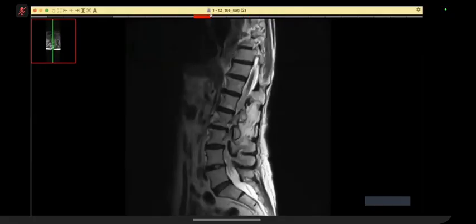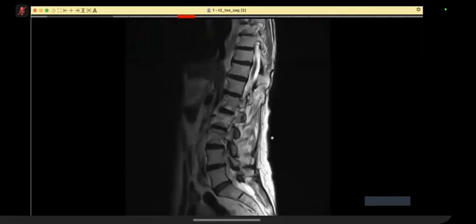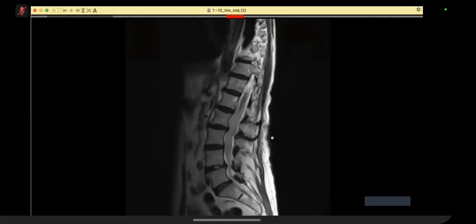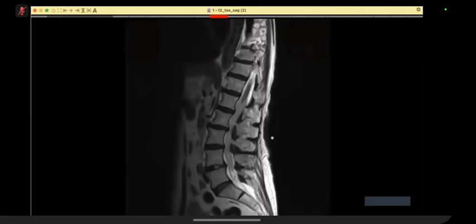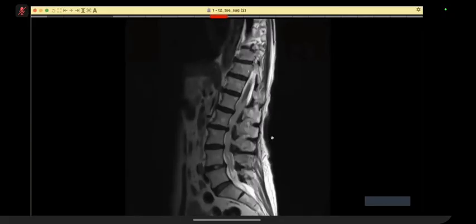There is an intraspinal soft tissue mass, soft tissue sheets filling the thecal sac. And I can see a patchy high T2 signal involving the vertebral body bone marrow. It may be a hemangioma; I will check the T1 sequence and see its signal later on.